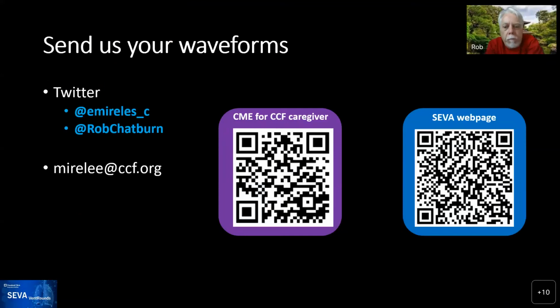Very good. All right, team. This is it. Thank you, Ariel, for the images. These are very educational and appropriate, and you can see the effect of sequence and how, using goal-directed mode selection, looking at comfort or safety, you end up adjusting the ventilator a little bit more until you achieve what is most appropriate for the patient under the clinical goals of the whole team.